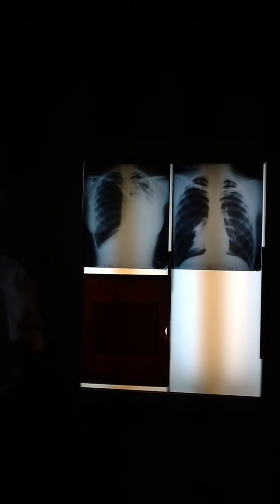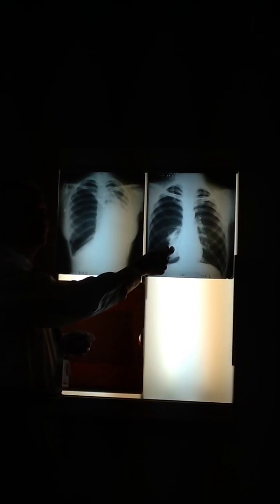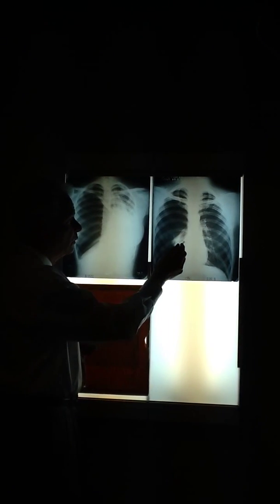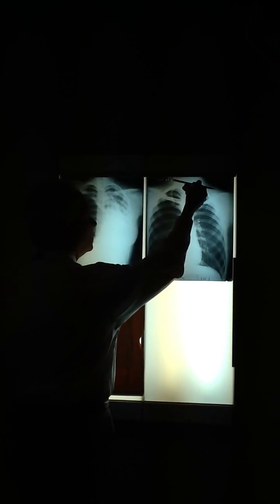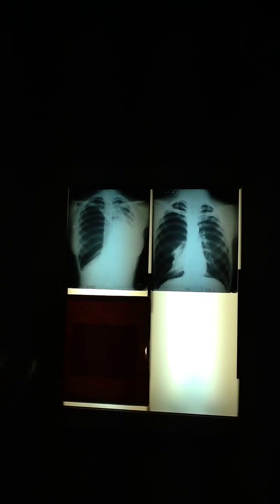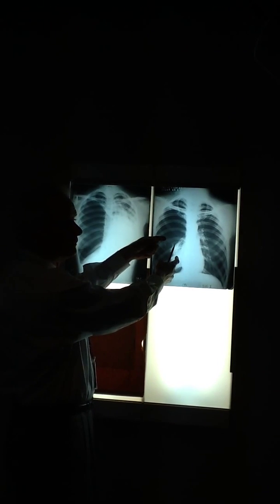We have two density changes here, don't we? Unilateral localized water, because this doesn't look like this, does it? So we've got unilateral localized water, and we've also got unilateral hyperlucency of almost the entire hemithorax on the right side. So we've got two density changes. You see that?